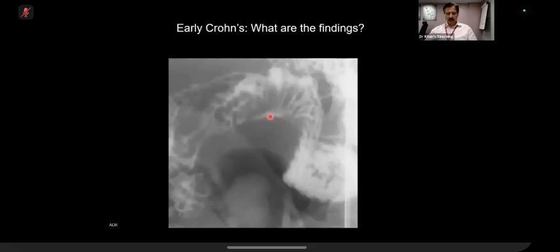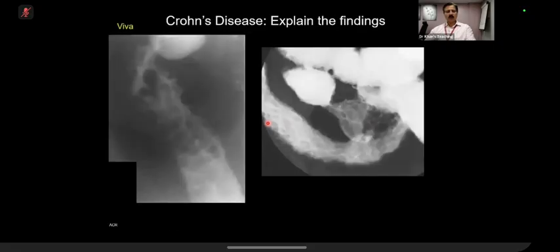Actually, this is an ulcer, and the mucosal folds are radiating towards it. It's a deep ulcer. It's just like a knife edge, stab type of an ulcer. With that comes this classical exam finding. Yes, candidate 8. How will you describe this? This is a classical exam finding.